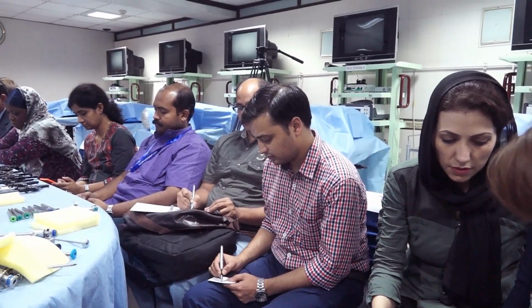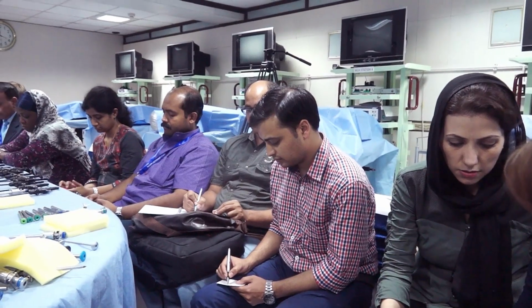And the last set is energy sources, like the different types of energy like monopolar, bipolar, harmonic, ligasure, and we have NCL, thunderbeat, laser, hydrodissection, and all the advanced technology I have to discuss.